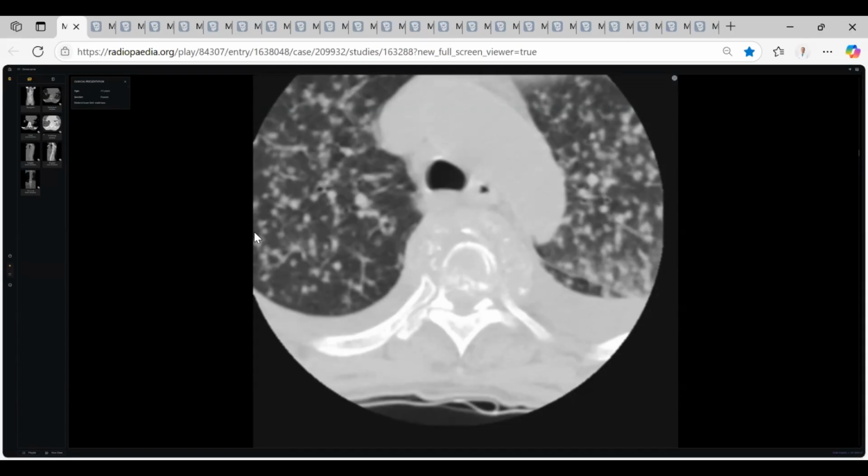So in this background, with the lung having multiple nodular miliary-like shadowing, and also the prevertebral collection, collapse of the vertebra and lower limb weakness, I am thinking of the possibility of this being spinal tuberculosis, an infective discovertebral tuberculosis due to the adjacent lung changes. What will you do next?